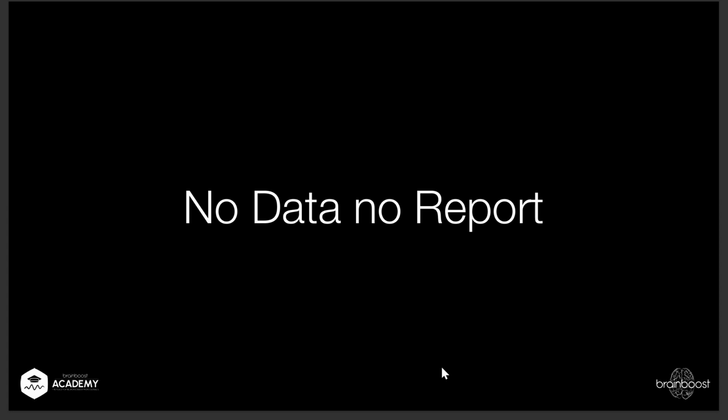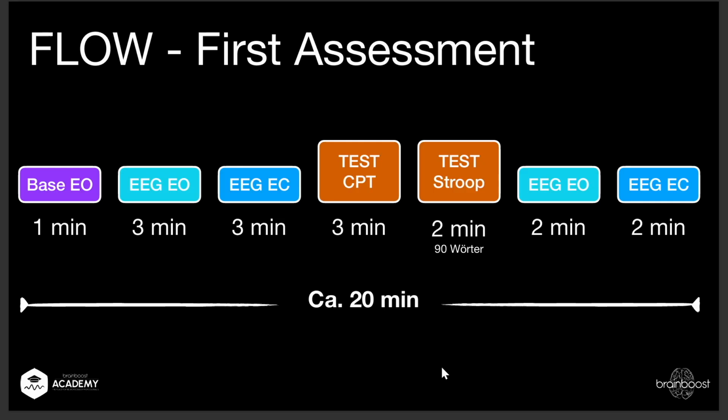And this is a question I addressed before. Some people ask, how does a first assessment work in your clinic? What do you do? There are tons of different variations. Of course, there are some flows. With the button I showed you in the top right, there are different ones, but one I would strongly recommend is this flow that takes around 20 minutes.